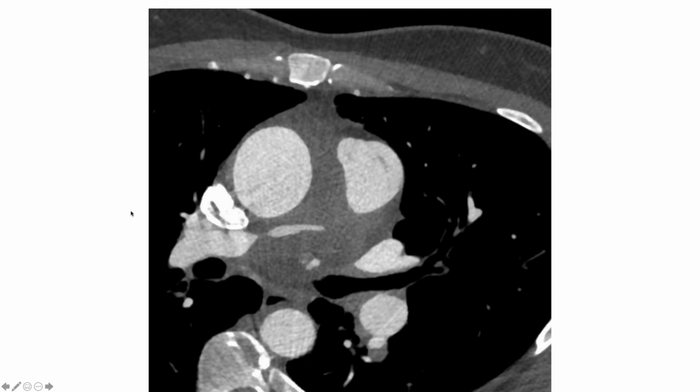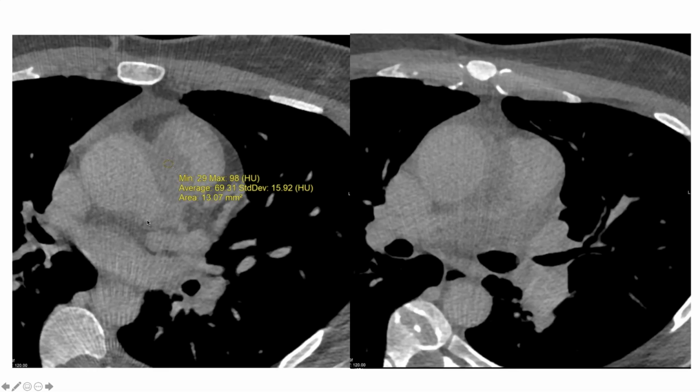I think with vasculitis in general, I see smooth tapering as opposed to this kind of aggressive looking pattern of narrowing. It looks like large bites, and usually there's quite well-defined thickening of the wall that's more often symmetrical. Although, you know, I have seen Takayasu's do this too.